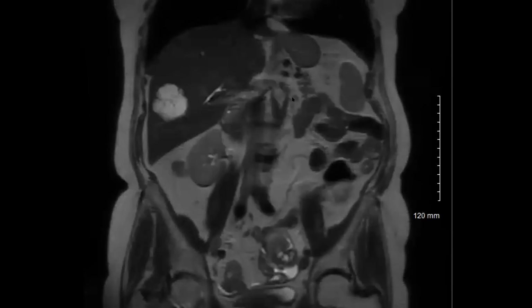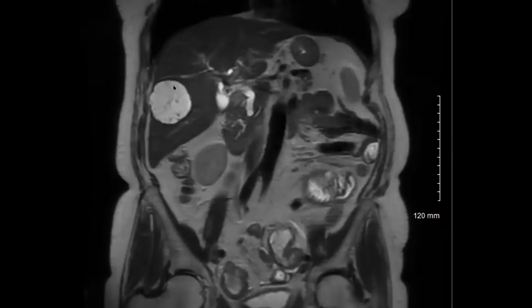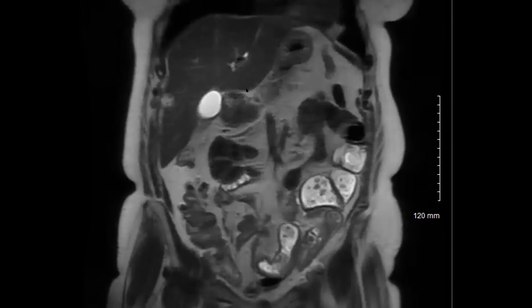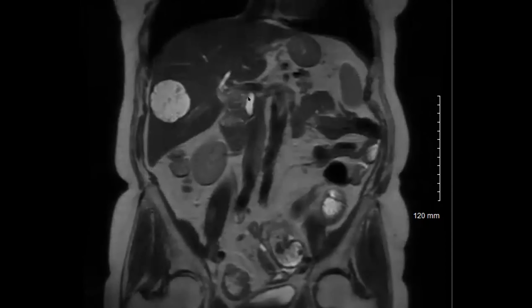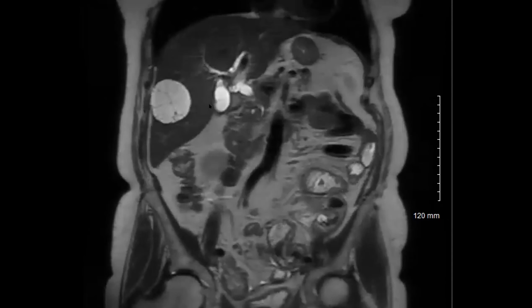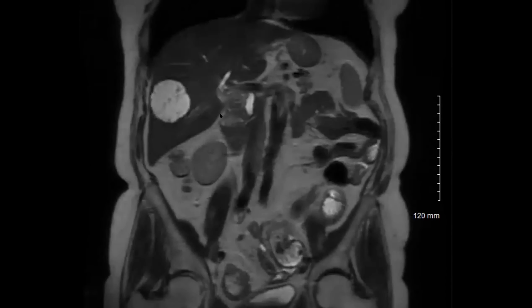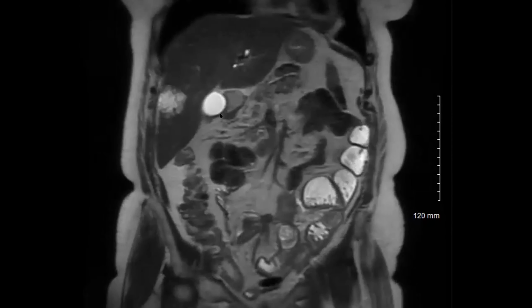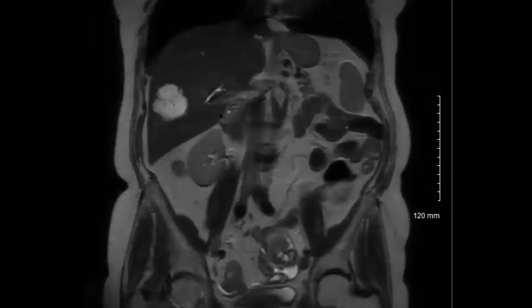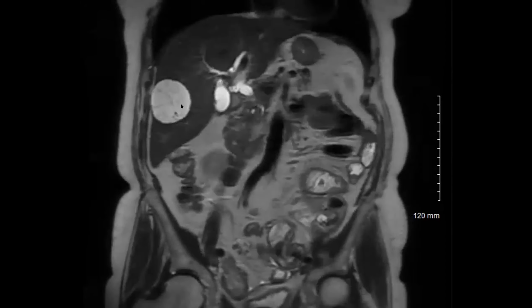Yes, that's a good point that you bring up, and I'll show you the coronal here. So this lesion seems to be very isolated. It doesn't communicate with any intrahepatic bile ducts. There is ductal dilation, but that was secondary to gallstones and obstructing choledocholithiasis. Then a stricture developed subsequently, but there was no obvious communication of this cystic mass with the ducts, and that's what Aarti is trying to point out. How do you separate MCNs, mucinous cystic neoplasms, from IPNBs, essentially intraductal neoplasms of the bile duct? The latter shows communication, the former does not communicate.